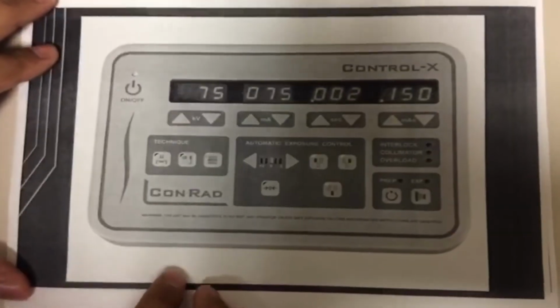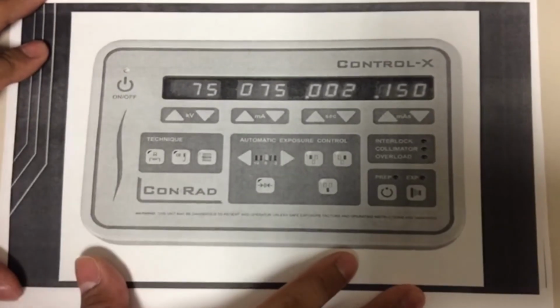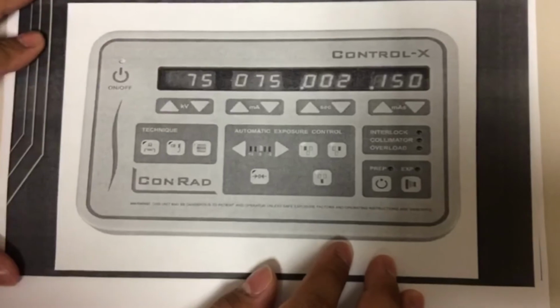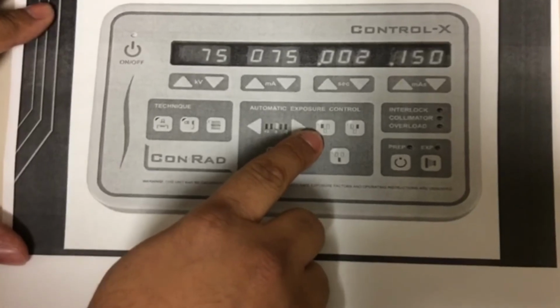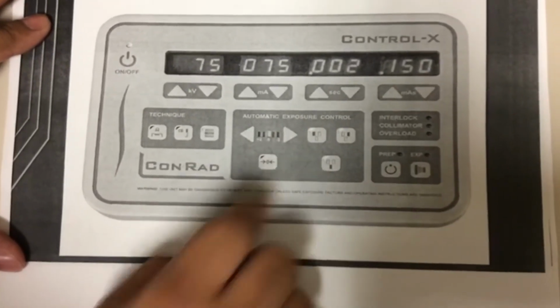Alright, so this is one example of a panel. I think Sophia, right? Showed me, I saw a video of a panel. You guys have something similar right now in the lab. But as you can see here, this is where you would have the selection of the chambers. So you have the left, the right, and the center.